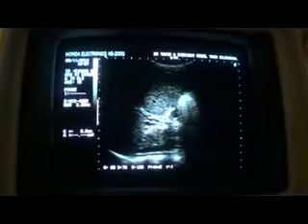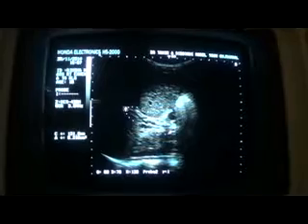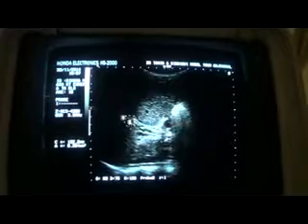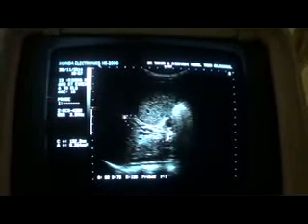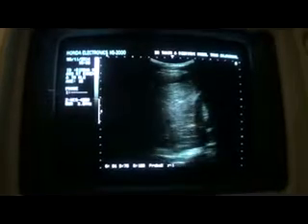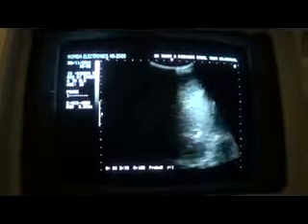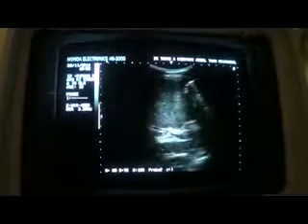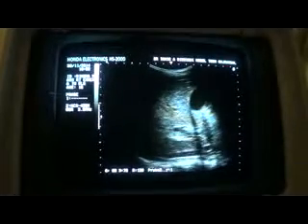So this tubular serpiginous shaped area with clear evidence is the cavernous transformation of the portal vein, or you can say the recanalization of the portal vein, which is seen in cases of long-standing or chronic portal vein thrombosis. So this is another finding, that is the cavernous transformation of the portal vein. Here I'm going to show you again.